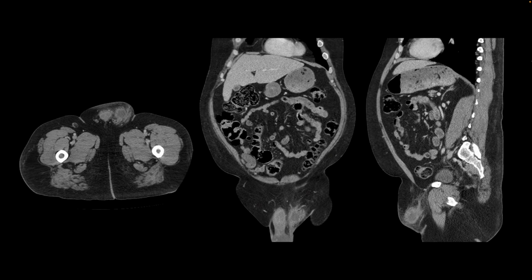So these are images from their diagnostic contrast enhanced CT, where we can see that there is some fluid. The fluid shows some rim enhancement, and there is some fat stranding. So they have developed an abscess in the left groin that was incidentally picked up on FDG PET, showing peripheral or rim hypermetabolism and FDG uptake.